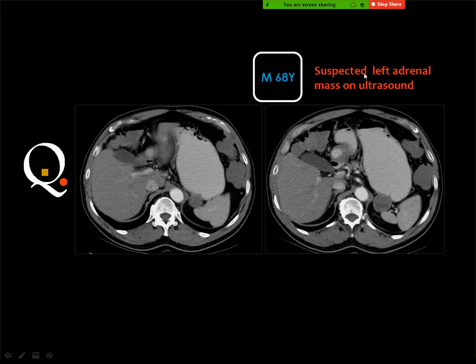This patient is suspected by ultrasound to have adrenal adenoma. Polysplenia. No. This is the lesion, and this is the spleen, which should be similar to the adjacent spleen, but this is the lesion. What do you think?